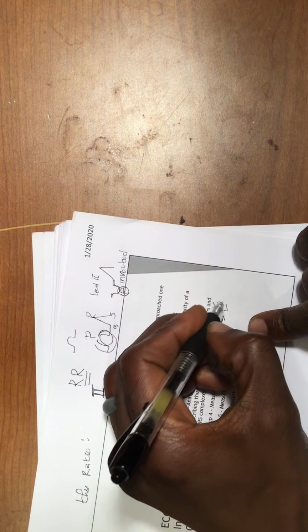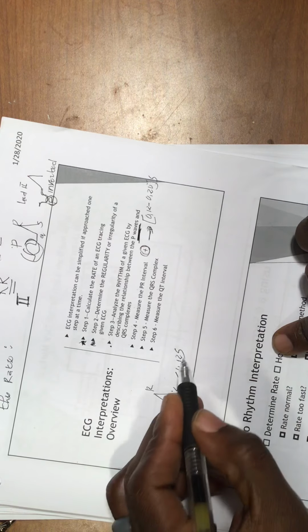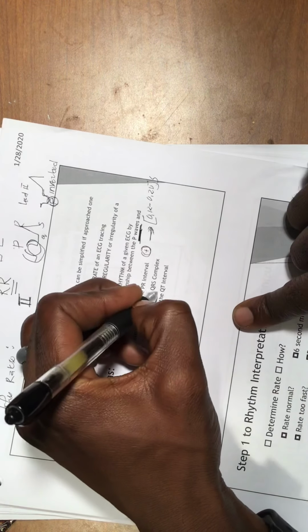And after this, you're going to have to measure your QRS. Remember that your PR interval is 0.12 seconds to 0.20 seconds. Very important. Now remember, we were talking about the QRS complex. The QRS is less than 0.12 seconds. I put it right here. The QRS complex is less than 0.12 seconds, and more than that is abnormal. This is the reason why you see they have an accentuation of this. That means they insist on the QRS.